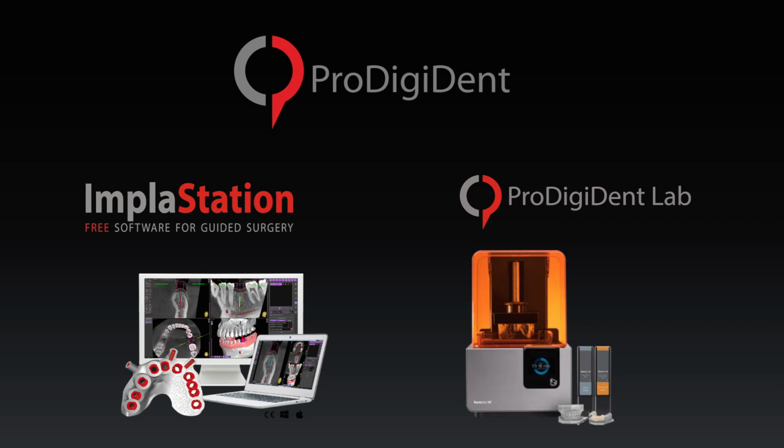The software, ImplaStation, is intended for implant planning and surgical guide design. The main concept promoted by our company is the creation of a free and accessible platform based on our software for dental treatment planning and sharing information among team members worldwide.